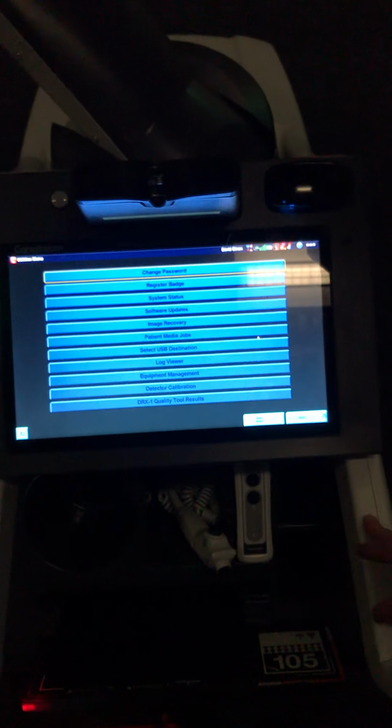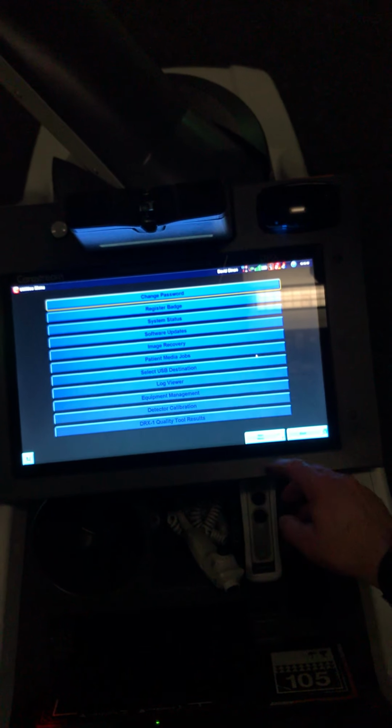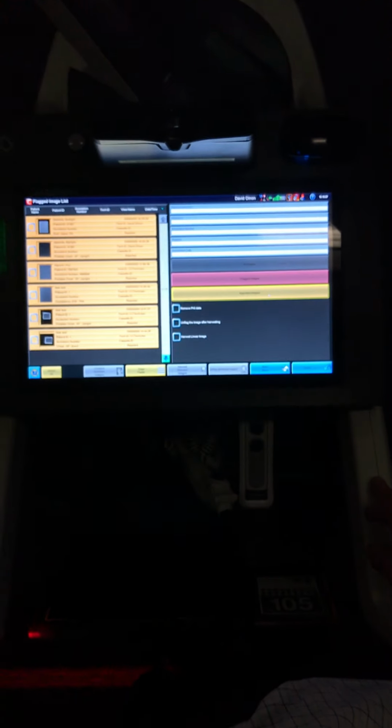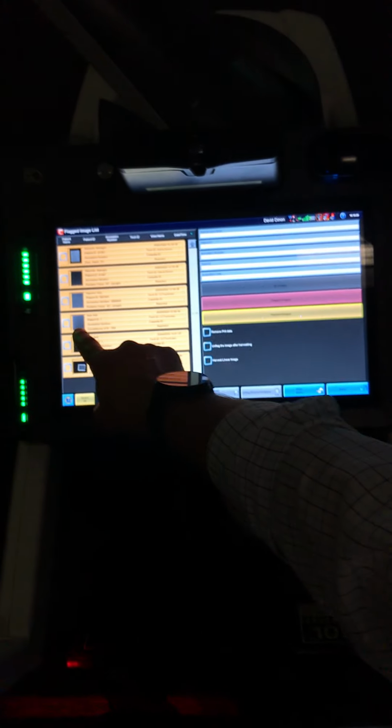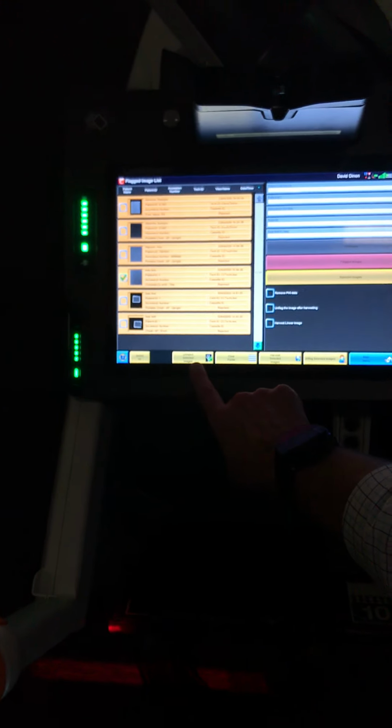When you have a tech access to rejects enabled for your basic users, it will give you rejected images as a selectable option in this screen, and that means that it takes you off to a screen that otherwise key operators can see, which is the flagged image list, and allows people to see just the rejected images, and they can choose to unreject. See the button here, unreject.